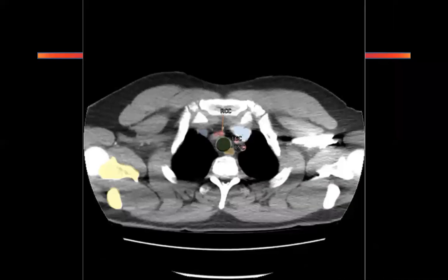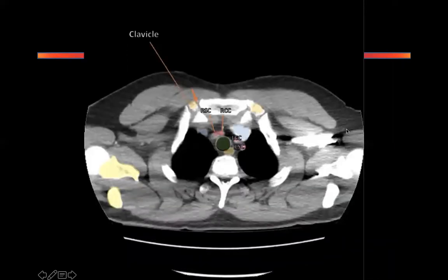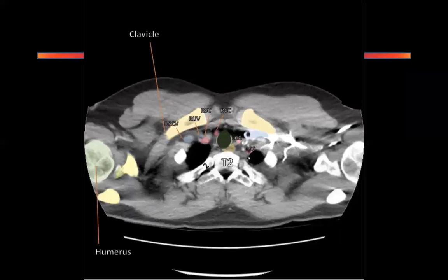And the RCC is forming. Okay, it's breaking. See, the right brachiocephalic is breaking into the right subclavian and the right common carotid. If there is presence of left SVC, so there will be discontinuation of the brachiocephalic vein. That is correct.